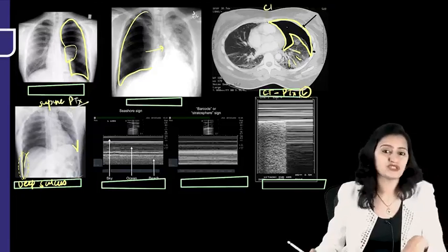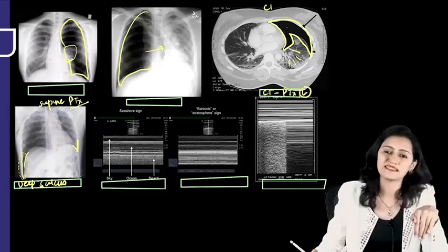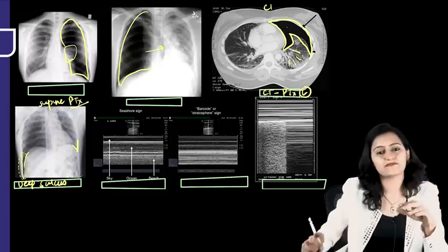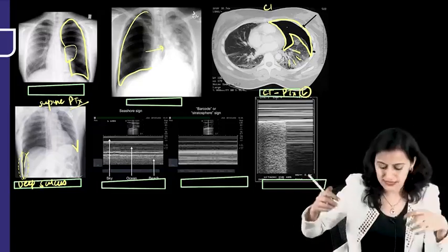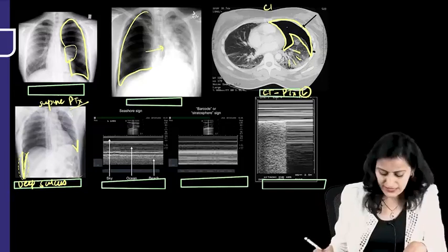So in ICU patients who cannot stand erect, we do the supine X-ray, and the pneumothorax is detected by the deep sulcus sign. The air going into the sulcus makes it deep, right? You can see the black air in the sulcus.